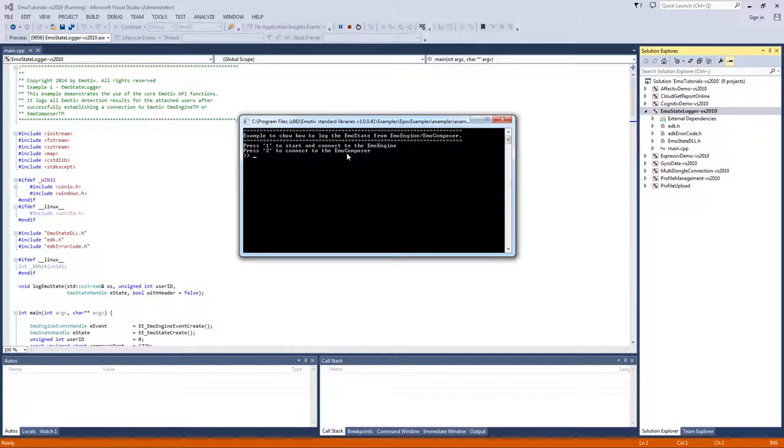Let's go ahead and connect to the headset. You can see here, none of the information is displayed directly. It's just logging all of that to the file that we provided through the command line argument. We'll let this get some data and then look at that file right after this.